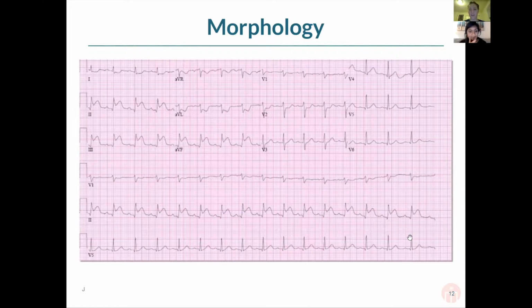So if anyone has any ideas, you can start putting chat ideas of what you think might be going on. You can be very broad and say this is happening, or you can be a little more specific and identify exactly where the morphology is. And I see some answers already coming in.